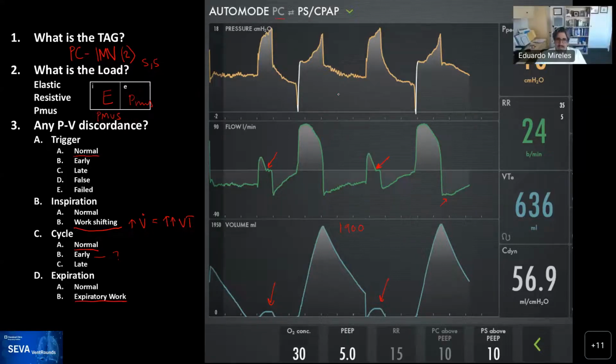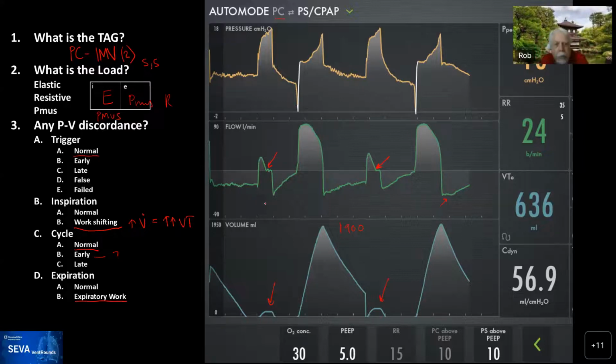The thing is, these mandatory breaths, as you point out, they're not doing anything for us. No. So that would indicate that maybe what you do is either get rid of or probably turn the mandatory rate down, right? So they're not interfering as much, or just put the person on pressure support, straight up pressure support, if you're not afraid of them becoming apneic.